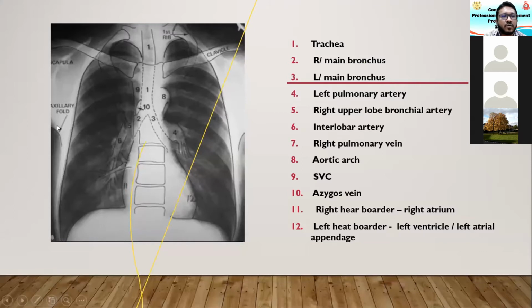Once you do all these in a chest X-ray, you always make sure that you look at the 4 corners of the chest X-ray, because you might be able to pick up a small extrathoracic pathology when you don't have a pathology inside the chest.